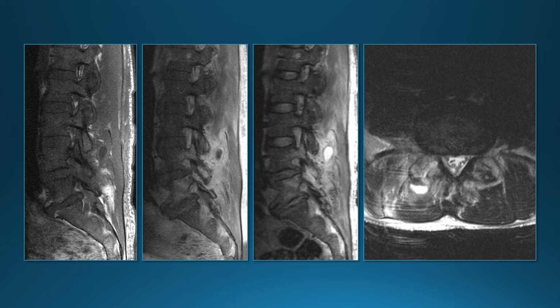A different patient, septic facet arthritis, and here the key to distinguishing a septic facet joint from a degenerative joint is the soft tissues. So here you can see a little abscess in the soft tissues posterior to the facet joint and a lot of edema. So the soft tissue changes generally will not occur with the degenerative facet arthritis, although the bone marrow changes can be identical.